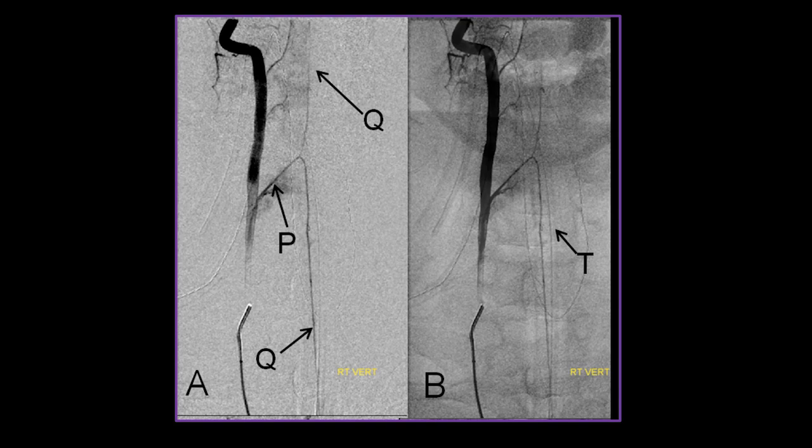These are images from a vertebral injection, and we show how this is a very well visible anterior radiculomedullary supply to this particular part of the spinal cord. And you see how the obliquity here is a little different because of the different growth in the lower part of the body. So here the obliquity is much less obvious than in the thoracolumbar region. The classical hairpin turn is classical for the Adamkiewicz artery rather than for the upper contributor to the anterior spinal artery.